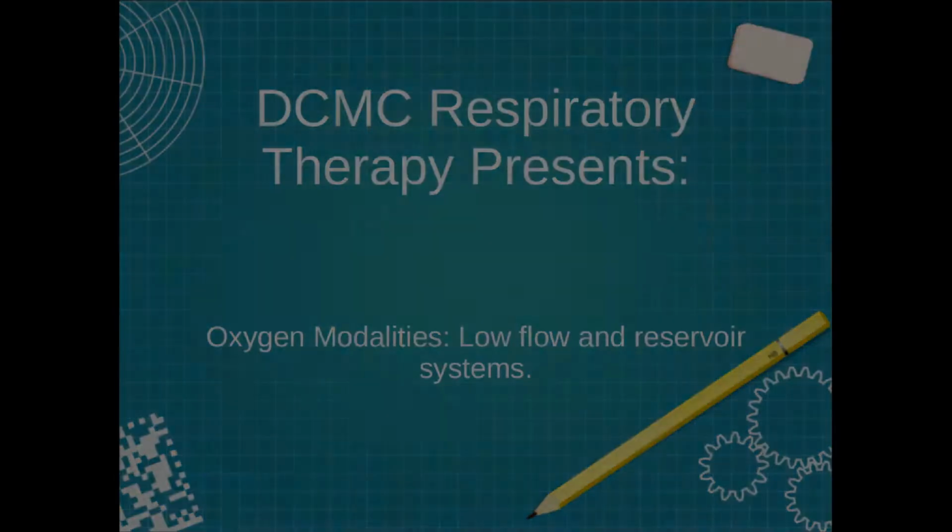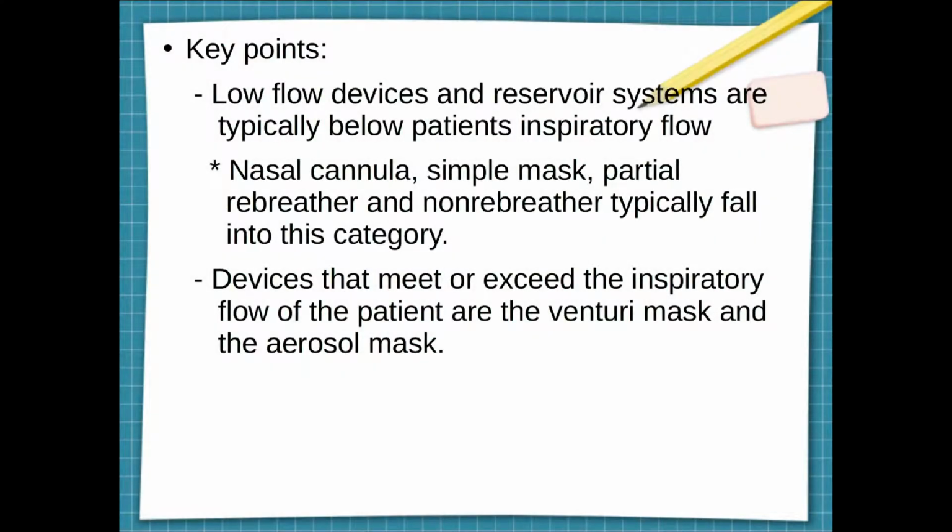This video will cover respiratory therapy oxygen modalities. We're going to start with our low flow systems. What that means is that the flow rate provided by the device is less than the patient's inspiratory flow, so the FiO2 will vary depending on the patient's rate and effort. The most common one that you'll see is the low flow nasal cannula.